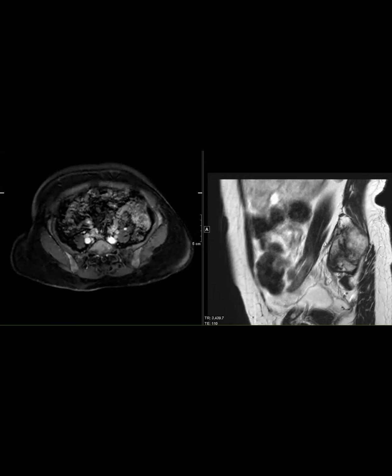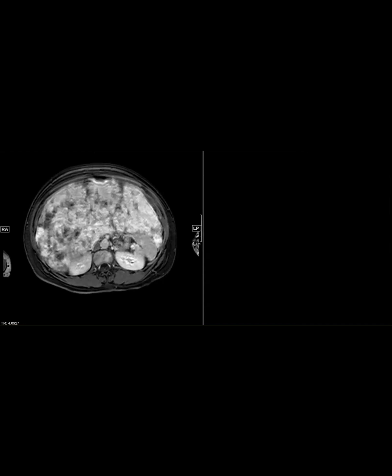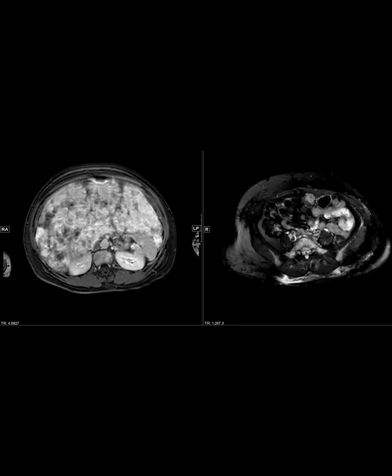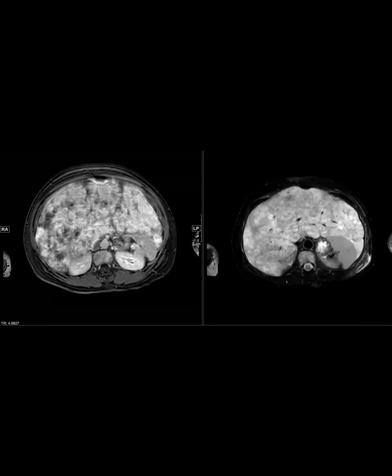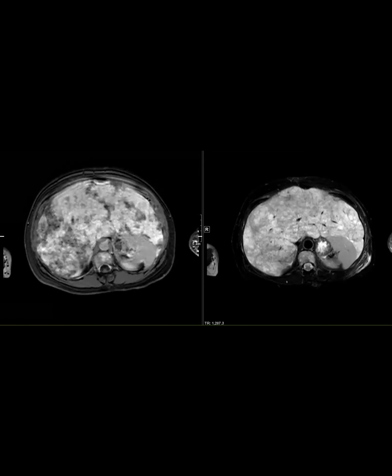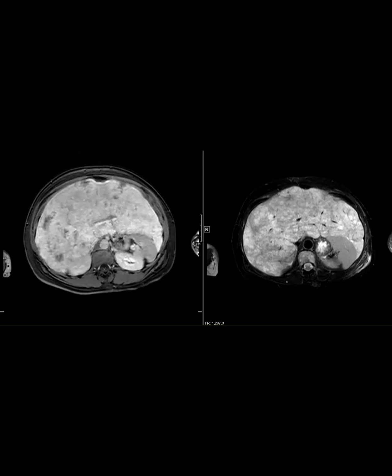The bones also look abnormal. So here's the liver. Let me see if I can bring up the T2. Gitanjali is saying HHT, which means hereditary, Osler-Weber-Rendu, right. So hereditary telangiectasia. This is actually excellent. This ended up being biopsied, and this ended up being hereditary telangiectasia.